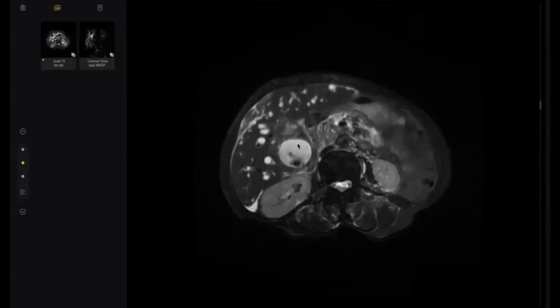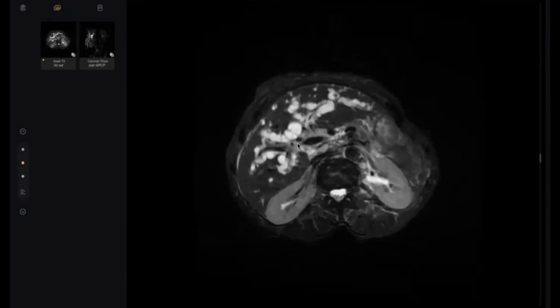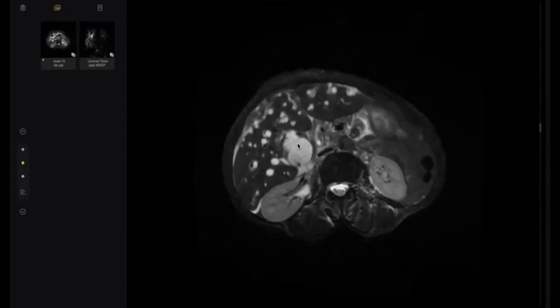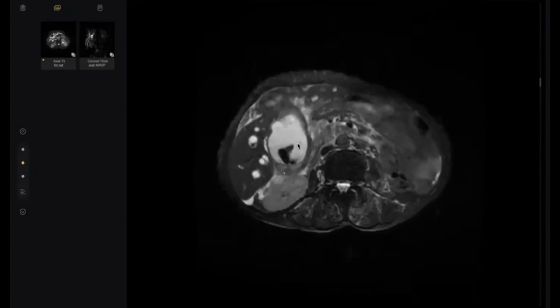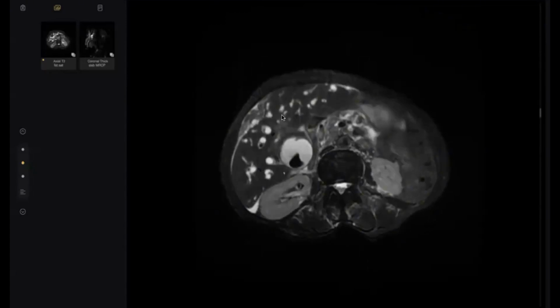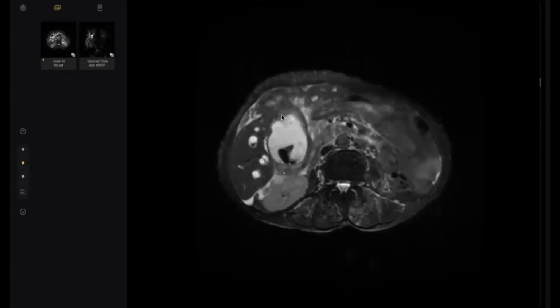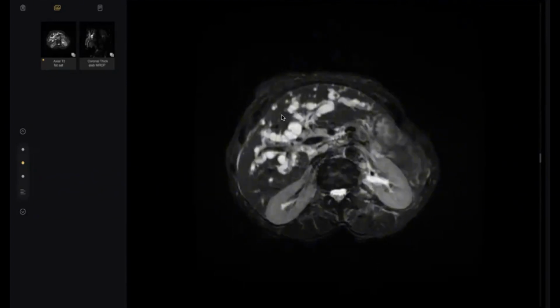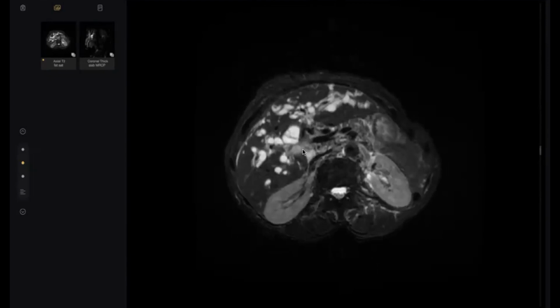Okay, it is very difficult, by the way, frankly speaking, without contrast, without other planes, to diagnose anything in the gallbladder in this situation. However, look here, there is some thickening. We make many possibilities, like gallbladder tumor, because the transition point is at the porta hepatis here. Okay, but here, as I think, there is some soft tissue.